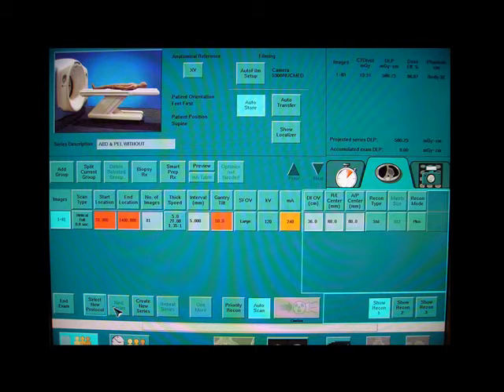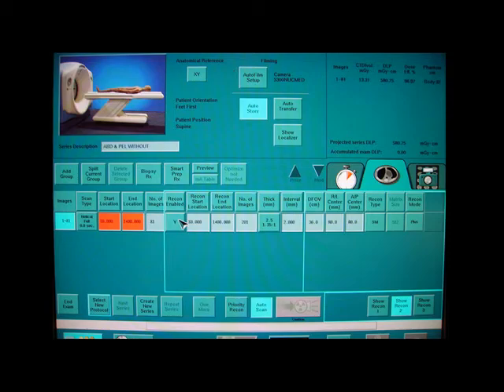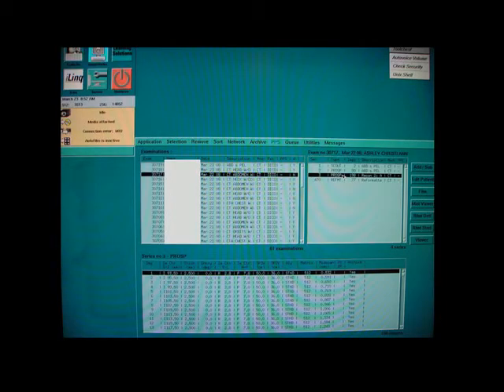Again, for the abdomen and pelvises, they've been doing coronal reformation, so you're going to turn that second Recon on, and here you go. It shows Recon 2. Recon enabled, yes, where the arrow is. And then you'll make your coronal images off of that. How do you do that? Well, I'm going to tell you.